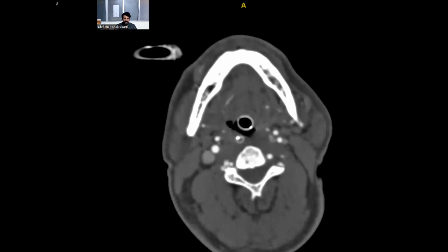The prototypical sequence that you want to look at for learning this is the T1 MPRAGE sequence. It will usually be there in the PACS in most patients, usually at the bottom of the list of sequences.